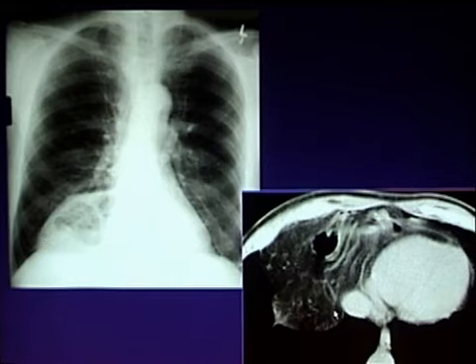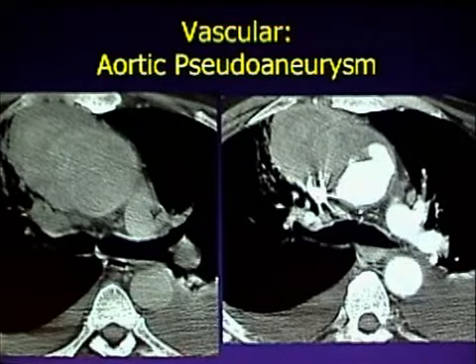Corresponding CT in this patient shows, number one, the very characteristic branching vessels, contrast enhanced in this case, omental vessels as they come streaming through this diaphragmatic slip. And we see a lot of herniated omental fat, and here's the nice gas-filled bowel loop. Here's another gas-filled bowel loop. So this, based on these two imaging findings, really isn't much of a dilemma.